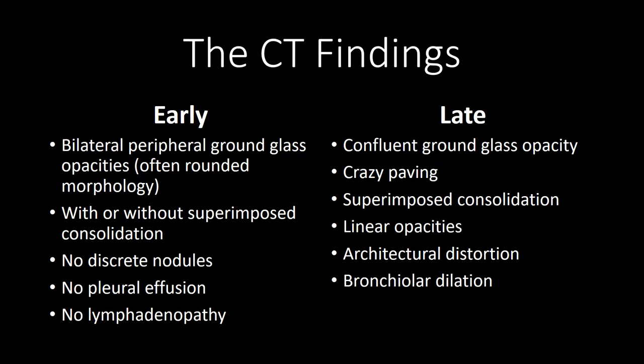Again, discrete nodules are not being reported, so well-defined nodules are not being reported. Pleural effusions are not characteristic of the disease, and lymphadenopathy is not characteristic.